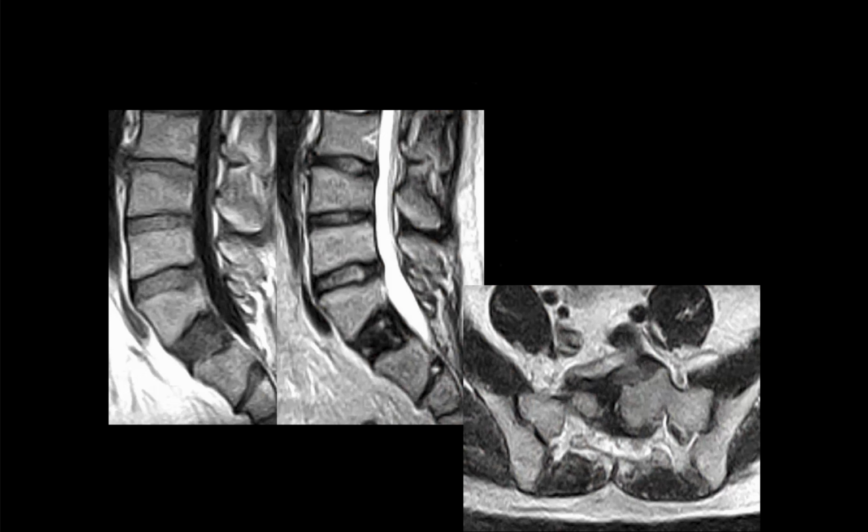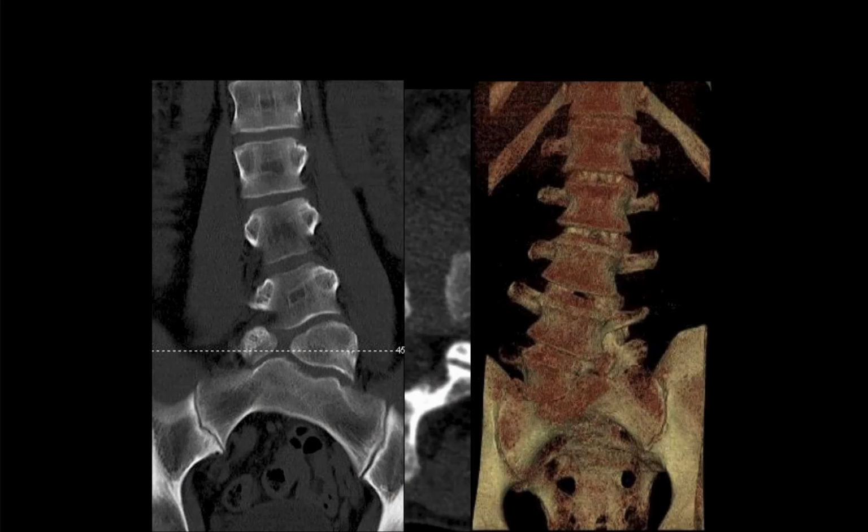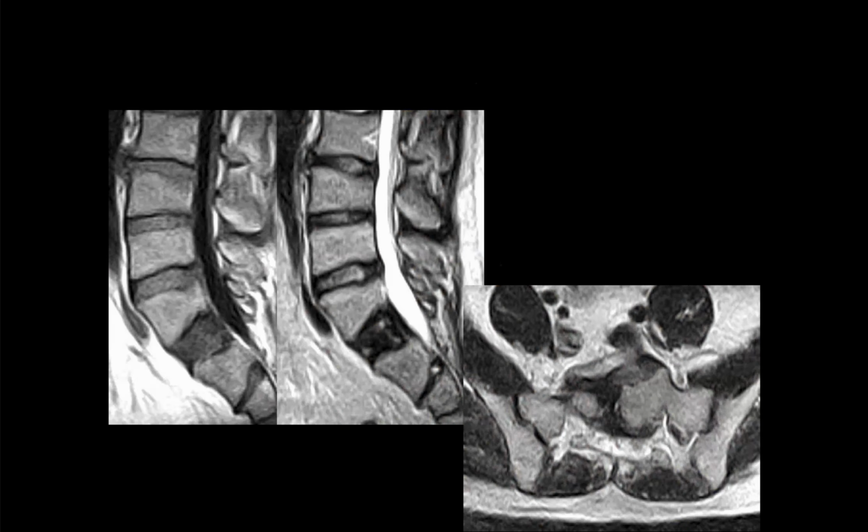And then would that be a spina bifida there also? Back here, I'd need to see the rest of the images. Okay. So here, this actually again shows kind of a cleft in the middle, and this can also be called a butterfly vertebra.